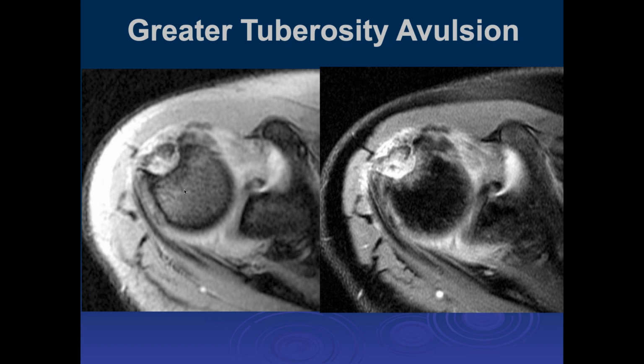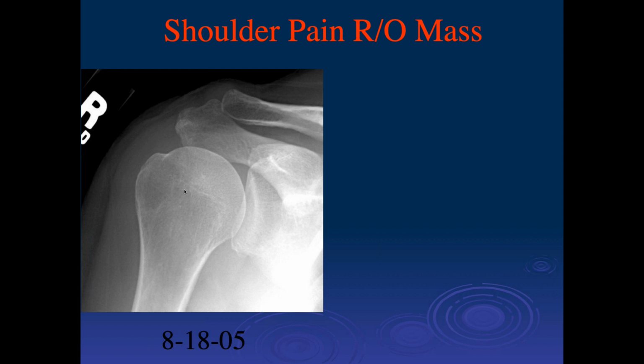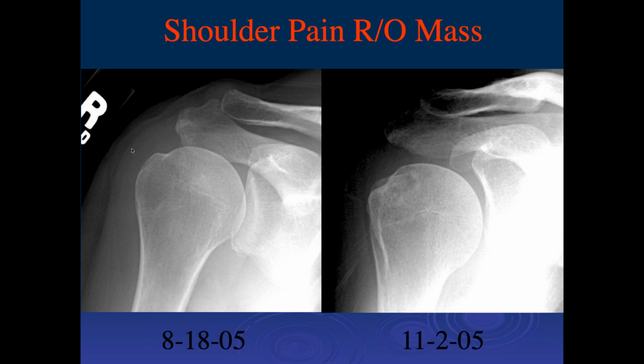Okay. So this must be a chronic greater tuberosity avulsion from an untreated fracture there undermining the greater tuberosity. On the X-ray, don't you think there's a soft tissue bump there over the greater tuberosity, the deltoid? I'm not sure, John. There may be. The deltoid is kind of prominent above it.